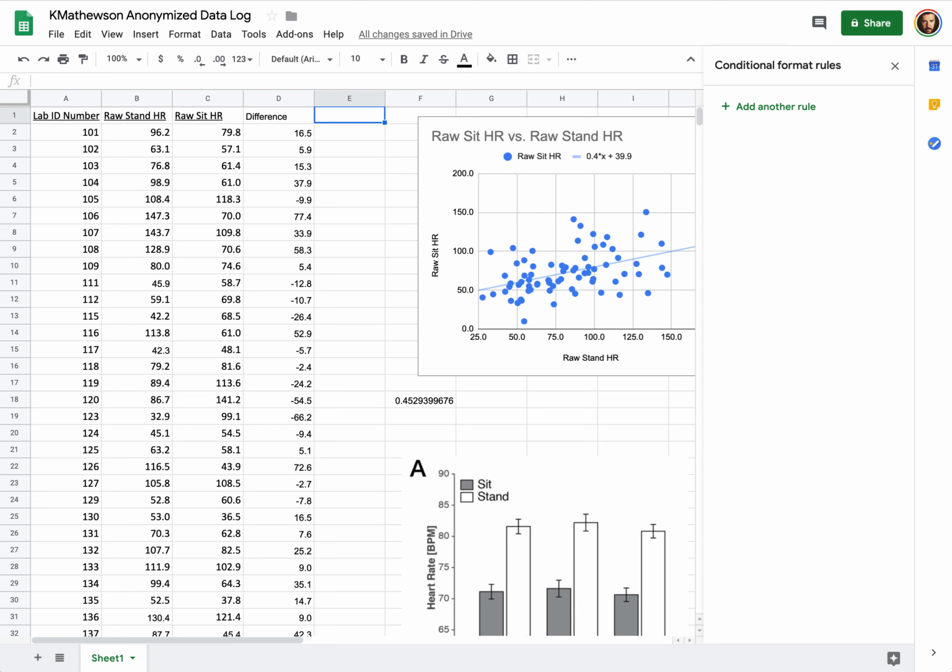And so here I'm going to actually make a list of random jitters, and you'll see what we'll do in a second. So I'm going to say that these are equal to 1 plus a random number between 1 and 0 divided by 10. So it'll end up being a random number between 0 and 0.1.